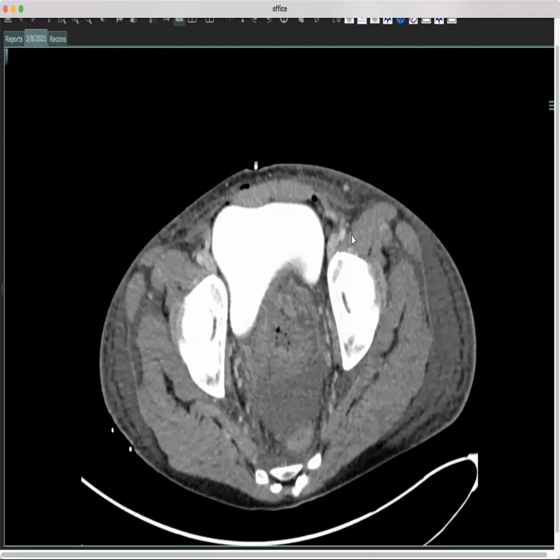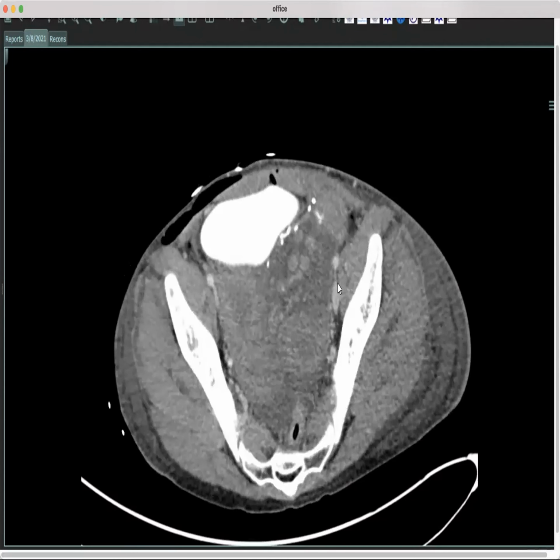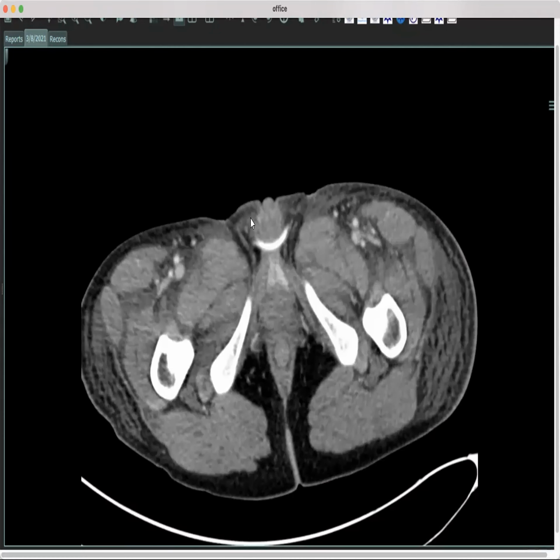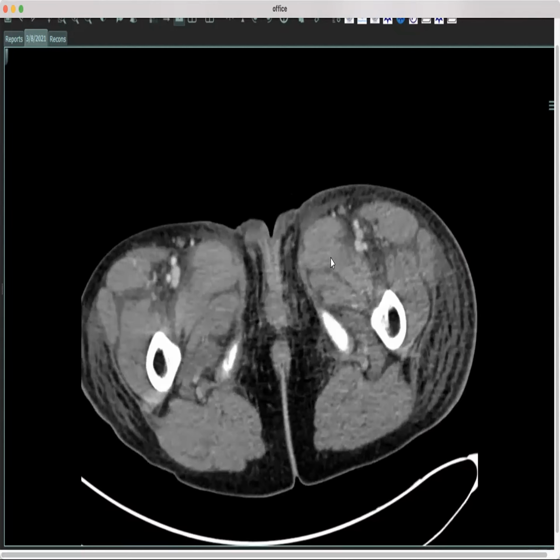Yeah, Ross, sorry, what surgery did you say they had? Oh, I just said they had surgery. Some kind of gender... Yeah, so I had that history, but I think you can tell what happened here.